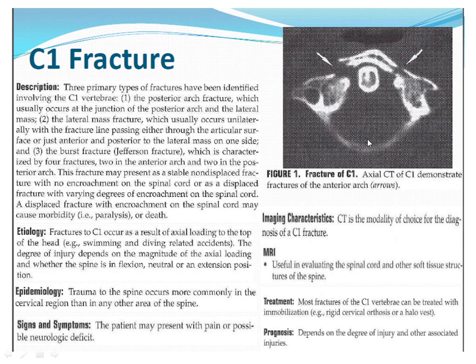So the reason you might be evaluating this on MRI would, of course, be the same reason as the burst fracture, just to make sure that there's no impact on the cord, no contusion of the cord, that kind of thing.